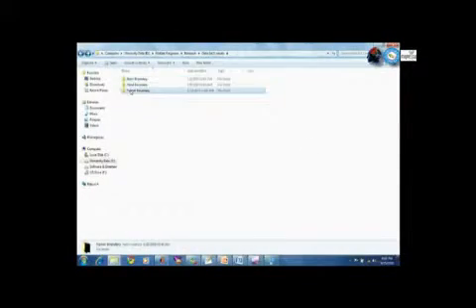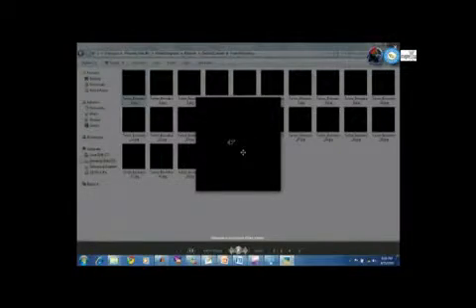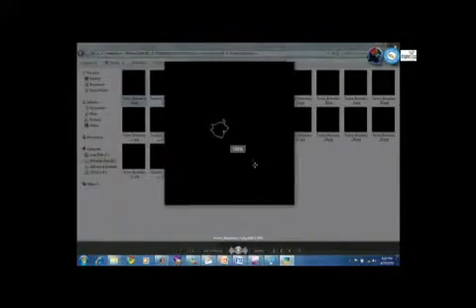In the tumor boundary folder, the tumor boundaries are saved. That's the tumor part in the image. We save these boundaries to check the accuracy of segmentation. Further, these boundaries are used for 3D modeling of skull, brain and tumor.